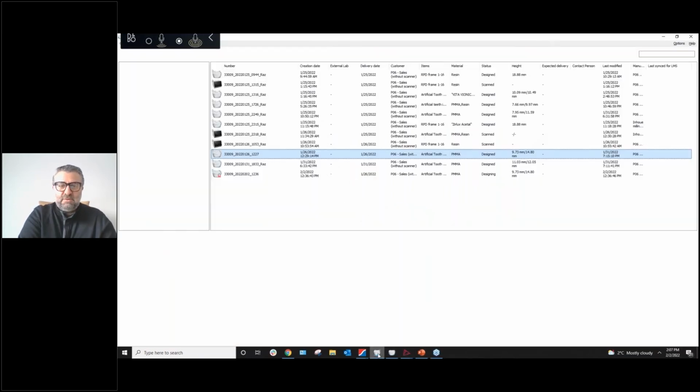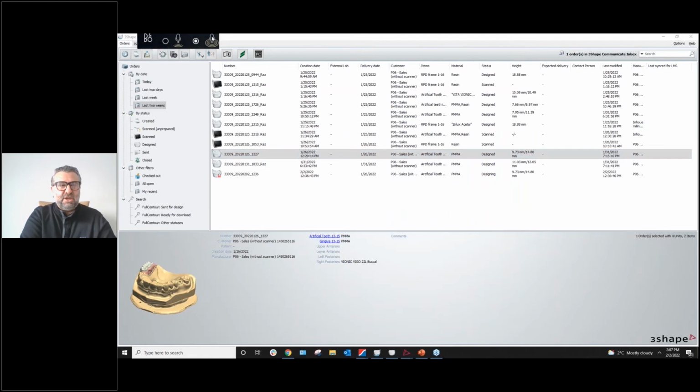So for those of you who are avid users of 3Shape, you know very well when you do an actual case, you have the capability to finalize as well as copy and append design. So for this particular case, as mentioned before, what I had was a patient who had some edentulous areas, and we wanted to do a partial and immediately do the actual resin and the teeth on top of it.